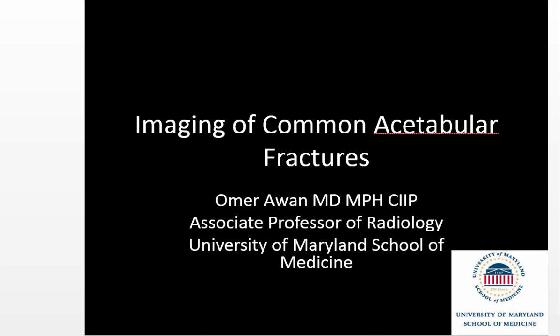Today I'd like to talk about a lecture on imaging of common acetabular fractures. This is a topic that I feel a lot of residents and even fellows struggle with in making a specific diagnosis on acetabular fractures, so hopefully I can elucidate that and relieve some anxiety when you experience complex acetabular fractures in the setting of trauma.